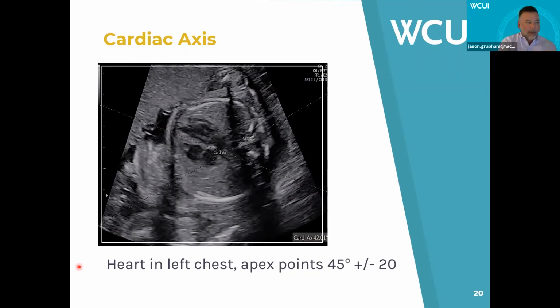And like we talked about earlier, I've found over the years, when you have a grossly abnormal cardiac axis, either rotated to the left or to the right, you really need to be thinking about extra cardiac anomalies. We started this talk by saying, if you have an extra cardiac anomaly, think about the heart. Here, if you have abnormal heart axis, you should really think about maybe some other things that are going on. Out of my wheelhouse, but in all of yours. Yes, you're absolutely right. We start thinking, what is the differential diagnosis for this? Why is it being pushed?